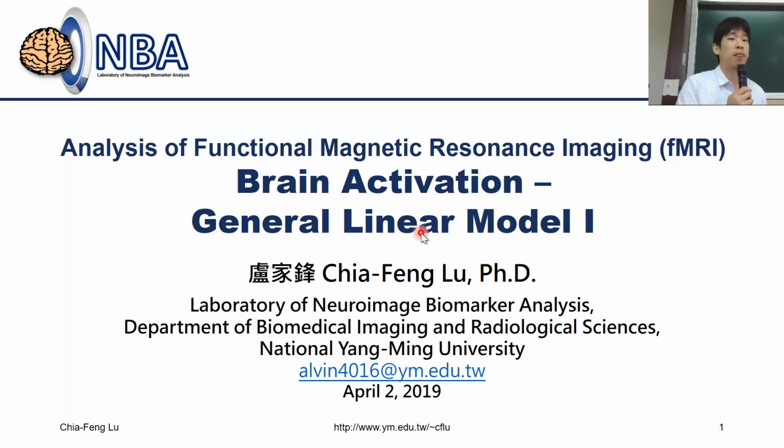Okay. Last week, we already went through the basic image preprocessing for the fMRI data, of course, using the SPM package. And this week, we will go to the next step, that is the analysis of brain activation, again using MATLAB and based on the general linear model.